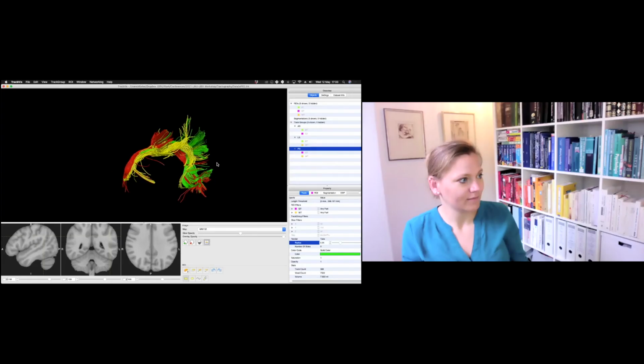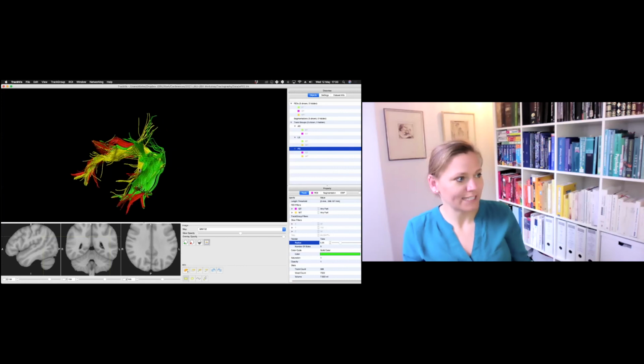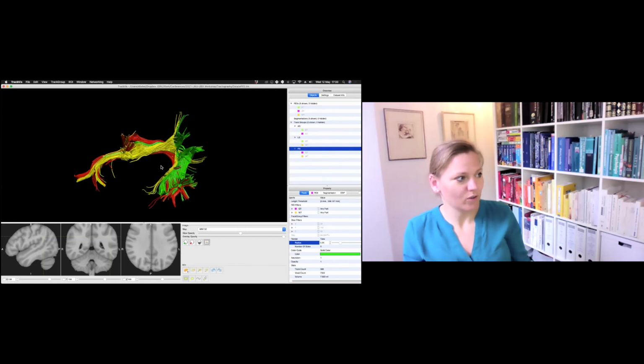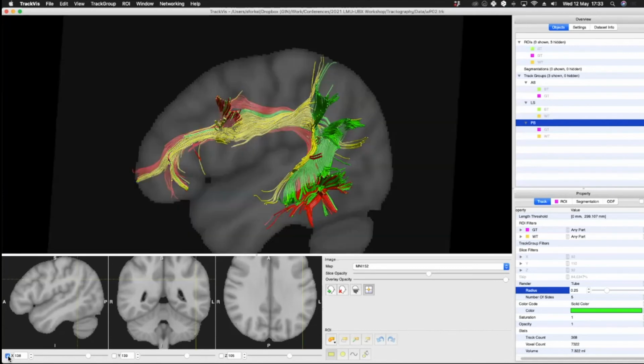So for those of you who couldn't resist and also did it, you will now realize that your 3D rendering is most likely a bit more clunky than it was before, because you're now taking up more memory. But one thing you can do now, and I'm just going to give you a bit of time to do that, is you can explore the anatomy.